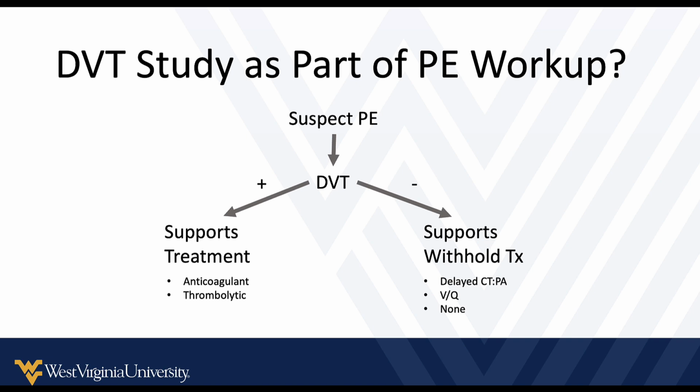I hope that makes sense, how sometimes doing a bedside DVT study can be an adjunct in part of your workup for pulmonary embolism, and sometimes obviates the need for other evaluation.